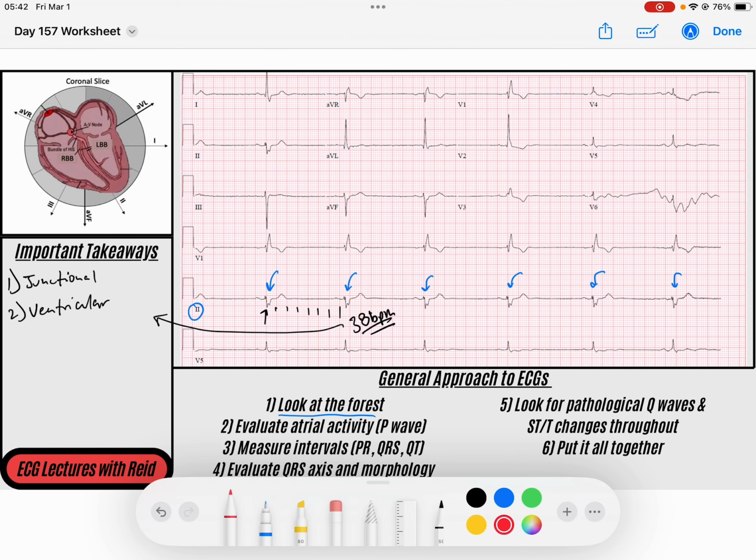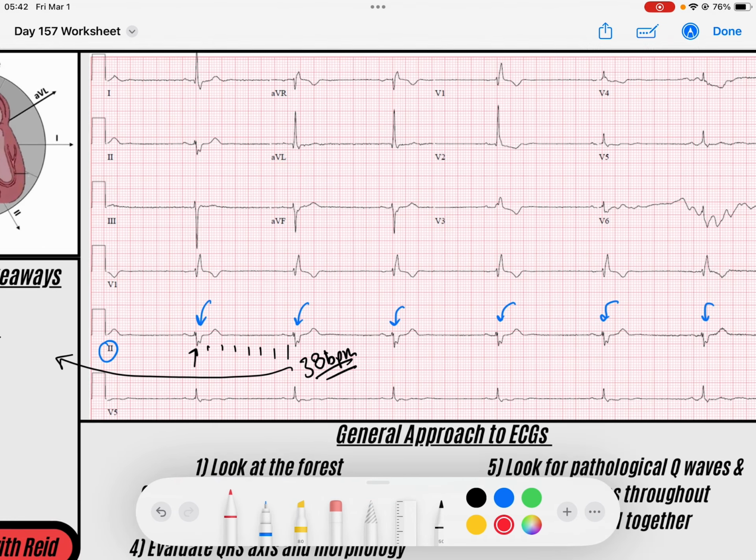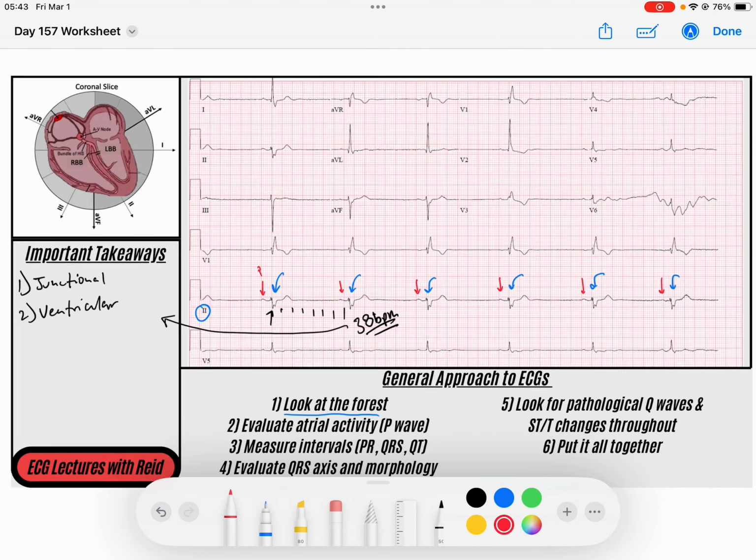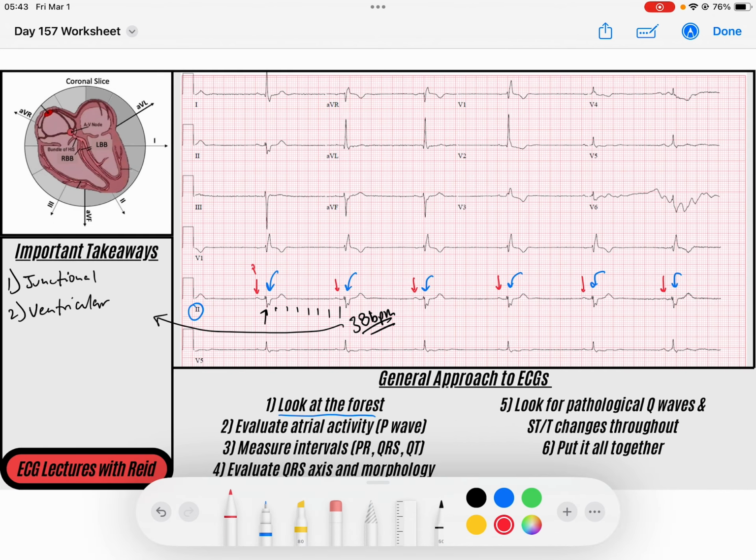And if I look, in front of each QRS complex, I do notice that there are P waves, right? You probably noticed the same thing. There are P waves in front of my QRS complexes, and they seem to be kind of in the same place every time. So I'm like, huh. Interesting. Maybe wasn't expecting that.